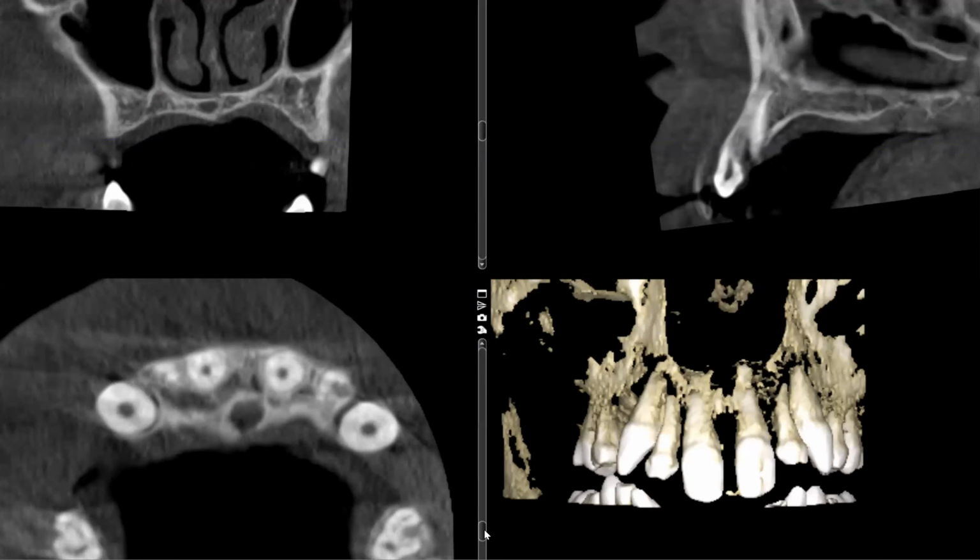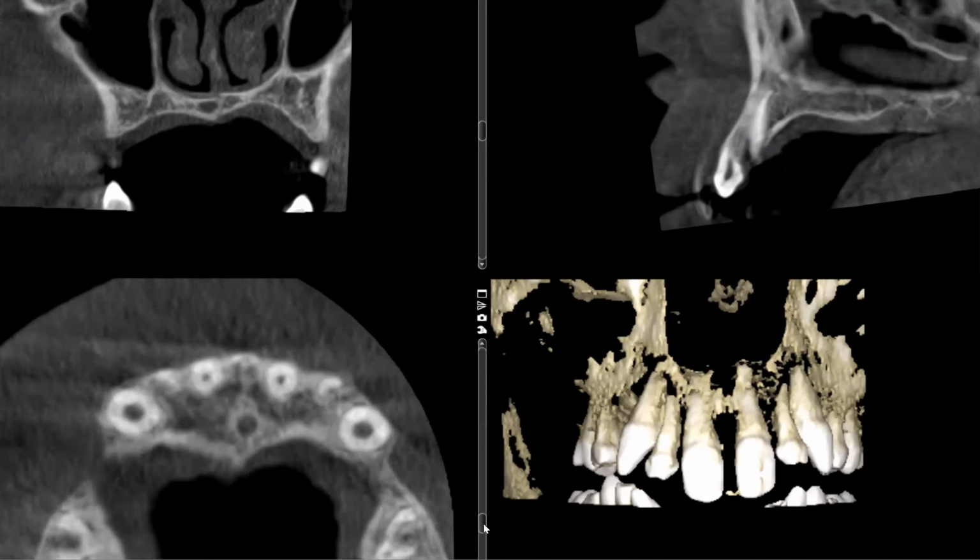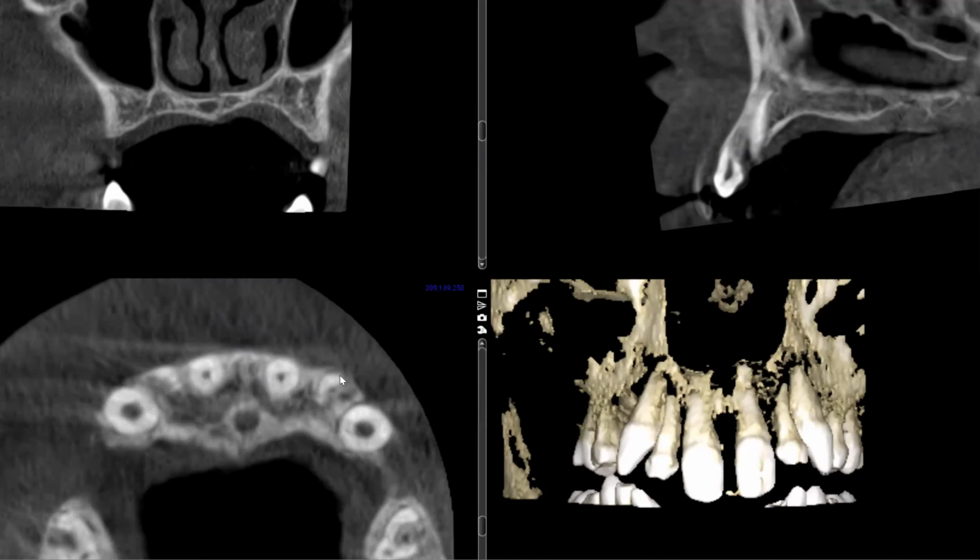When I say extends into the pulpal space, radiographically it looks like it's involving the pulpal space or the root canal, but histologically there's predentin that's covering the pulpal chamber, so it's not a resorption that literally went into the pulpal chamber. Okay, so I wanted to make that distinction. But you can see that there's not much tooth structure left.